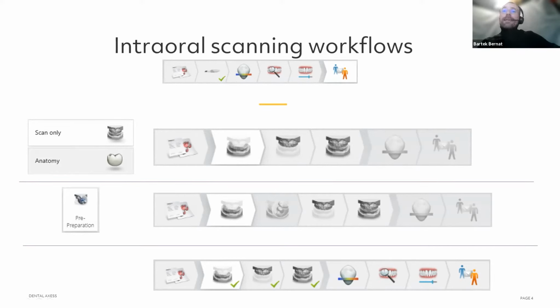And now with the new extra application that 3Shape has added, you can also segment the teeth and do some more analysis, also some simulation for the perfect smile. Mind, those sections here are entirely optional. You don't have to do it. You can turn it off and on to your liking. So once this analyze phase is all done, you are sending your order. So this is how it looks.